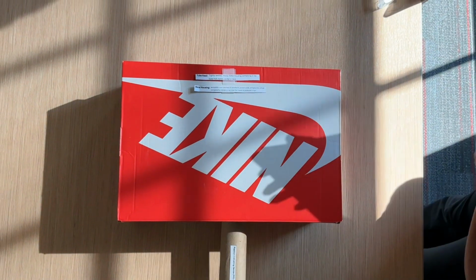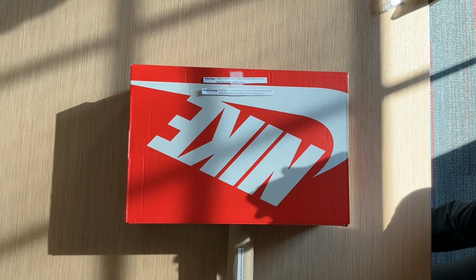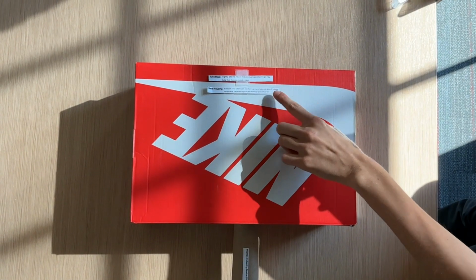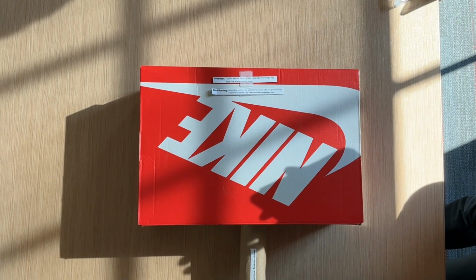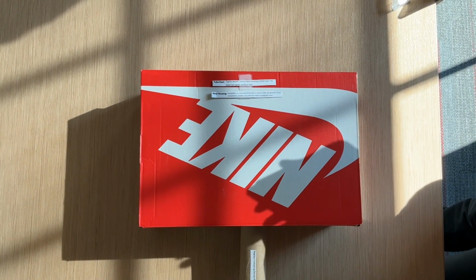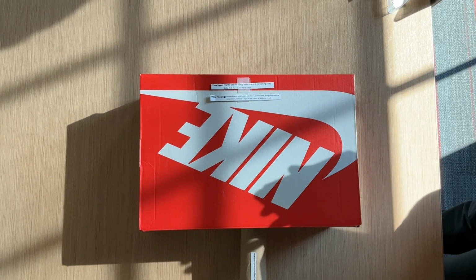This is the tube head. It is a tightly sealed, heavy metal housing that contains the X-ray tube that makes the dental X-rays. This is the metal housing that surrounds the X-ray tube head and transformers, protects the tube, and grounds the high voltage components that contain the X-ray tube that makes or produces X-rays.